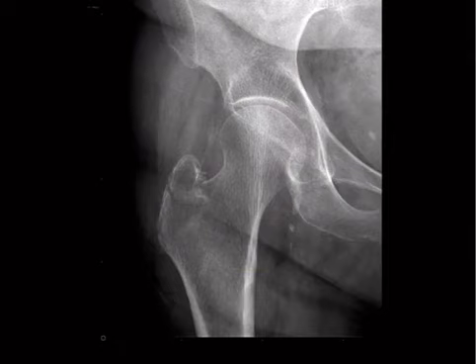All right, next case here. May or may not be able to see it. There's a fracture here. Okay, just looks like it sort of goes from here to here. I will tell you that if you see this, what you're supposed to do, and this would be a good next step question, is to get an MRI. Well, why would you do that? Because the extent of these fractures is often underestimated. This is a so-called tip of the iceberg fracture. There's several different ones, but this is probably the most classic one, and the fracture is actually way bigger than they thought it was.